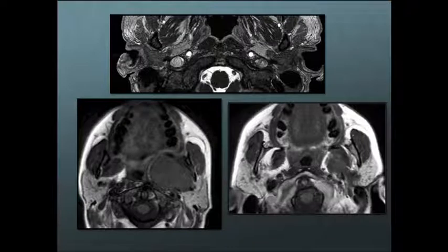Probably the most frequently seen masses in this location will be masses arising from the deep lobe of the parotid. And you can see why. The deep lobe of the parotid really protrudes into the parapharyngeal space. And as anywhere in the body, growing tumors tend to grow toward the path of least resistance. When you have this bed of soft fat, they grow into it and can reach quite considerable sizes. They will also show anteromedial displacement of the parapharyngeal space fat. So whenever you see a large mass in this location showing this medial displacement of the parapharyngeal fat, look to the lateral edge of it and see if you can see the extension into the parotid gland. Even if it's not clearly extending into the parotid itself, but you do not see a separate fat plane, you can assume that this is indeed coming from the deep lobe of the parotid.